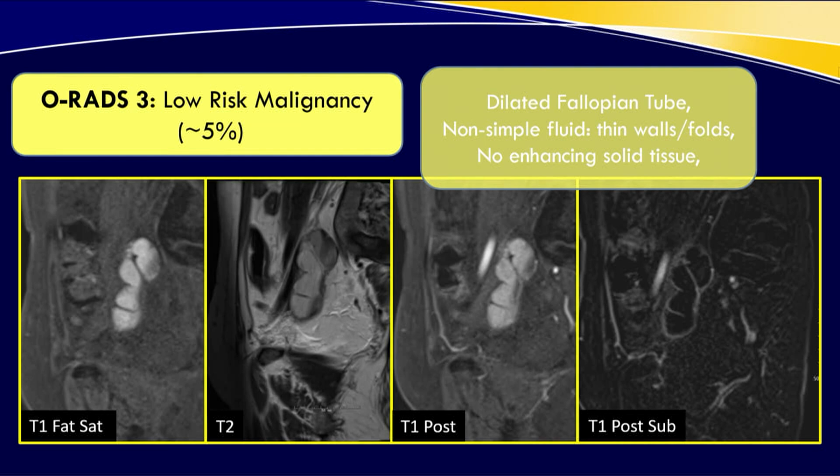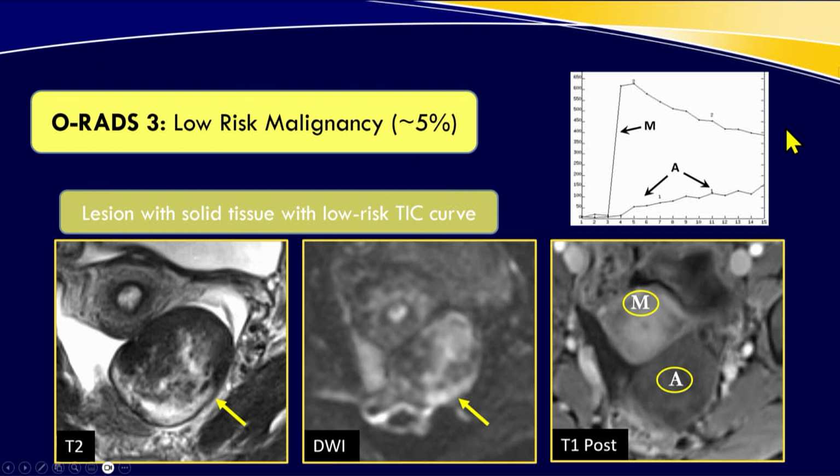And I think it's very hard on that just straight post-contrast image to say whether or not there's something nasty that's enhancing underneath. And again, that's where your post-processing with subtraction is really robust. Hopefully there's no misregistration and the patients don't move much in the pelvis between breath holds. So you really often can get a very good subtracted image. And this shows you that there's no papillary projections, mural nodules, or any complicating enhancing solid tissue elements.